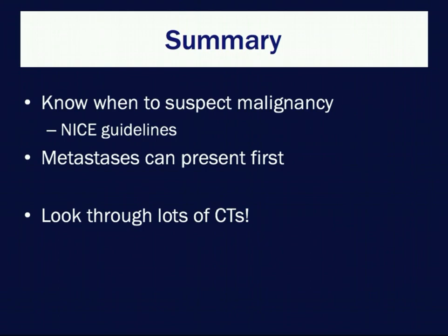If you're interested in radiology and want to get better at reading CTs, the most important thing you can do is just to look through a lot of them. And remember, it's just as important to know what normal looks like as it is to know what abnormal looks like.